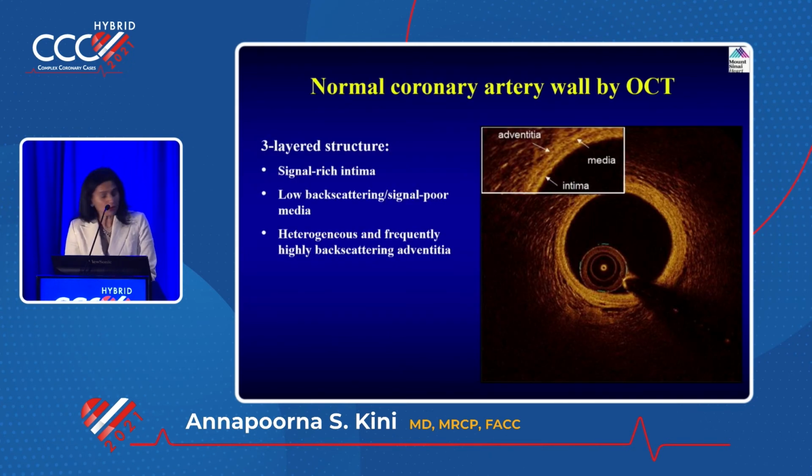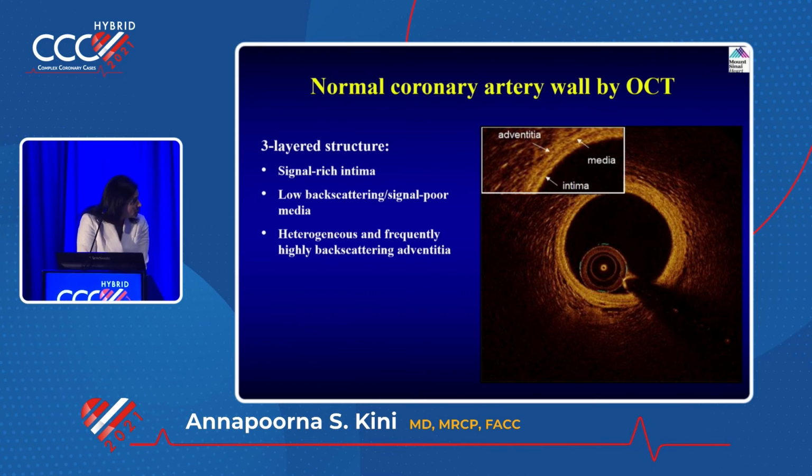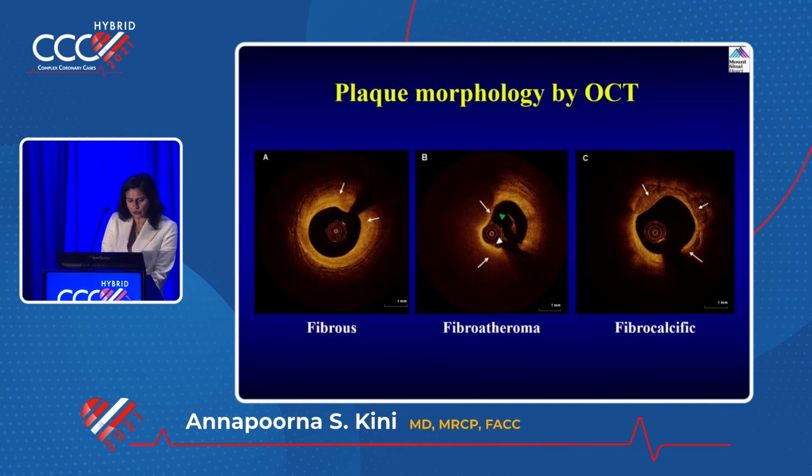So the other one is optical coherence tomography. Again, same thing, 3 layers. You are able to see the 3 layers, right? Same intima. Look at this nice media, adventitia. So this you are able to understand, morphology much better compared to the IVUS. But you have to know all this. We don't know which one they will ask. Okay, so this is how a fibrous tissue looks like.